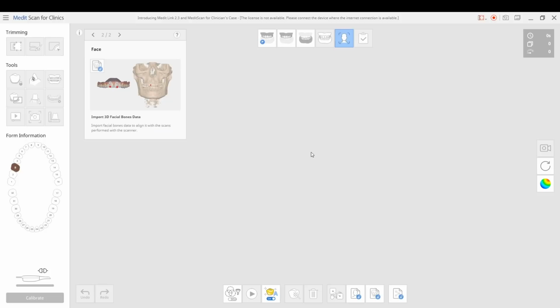So this is just incredibly advanced features where you can have multiple models for implant cases, where you have gingiva scans, and you've got scan body scan, multi-unit abutment scan, you've got pre-ops, you've got bite, you've got quite a few different layers of information that you can just keep building on, including adding the patient's face scan. So very, very advanced functionality and of great use.